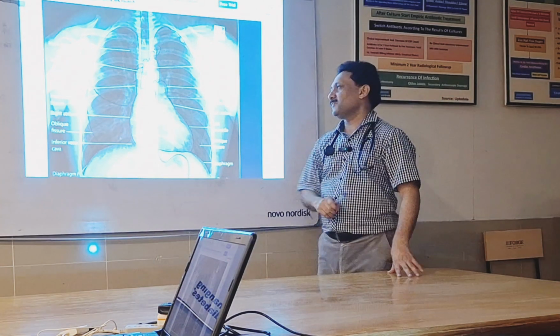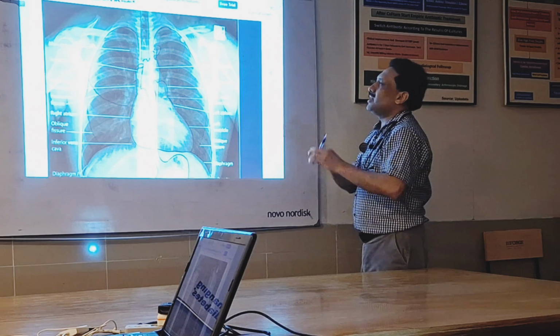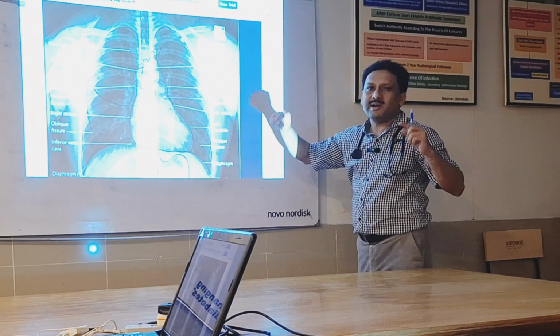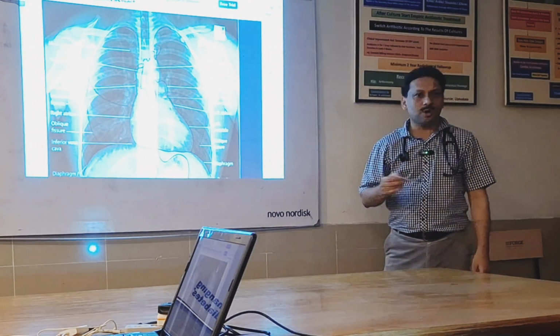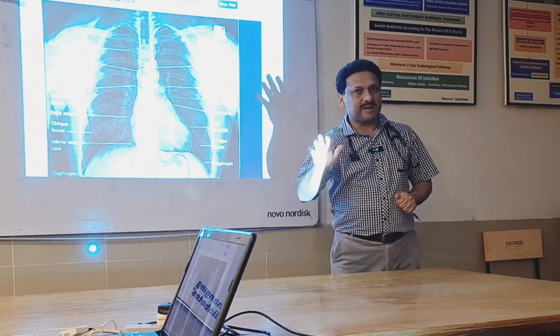Now we move on. Rather than moving towards that particular point, I would just like to highlight one thing more, that you want to know which one is the right side and which one is the left side of the X-ray. So how to know that? There are 5 landmarks. Remember those 5 points.